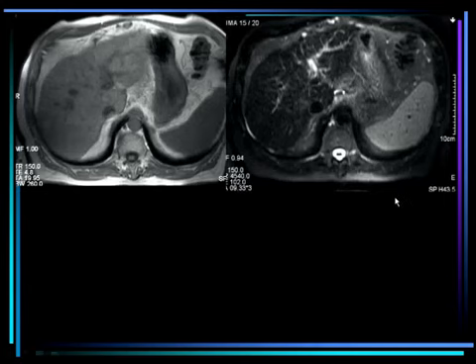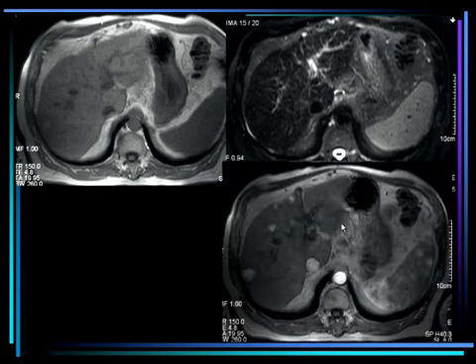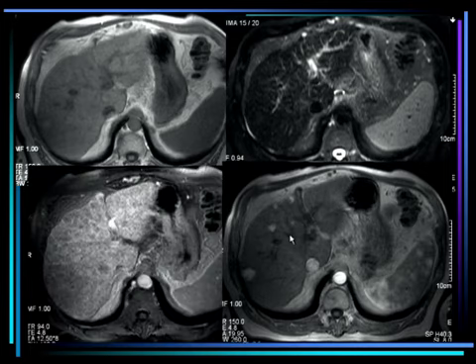than the hepatocellular carcinoma. So we have here a T1 weighted image by means of MRI. We don't see anything very nice on T2. This is the arterial phase, and this is the late phase. So what about those lesions? You don't see them very well. But this patient was operated, and this lesion had hepatocellular carcinoma.